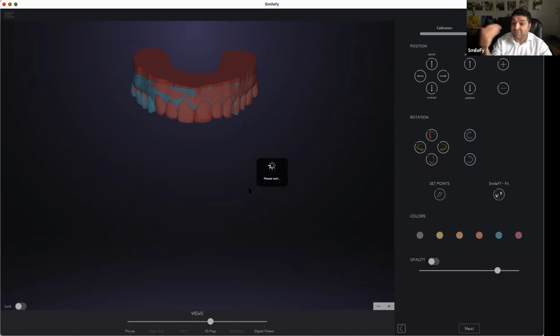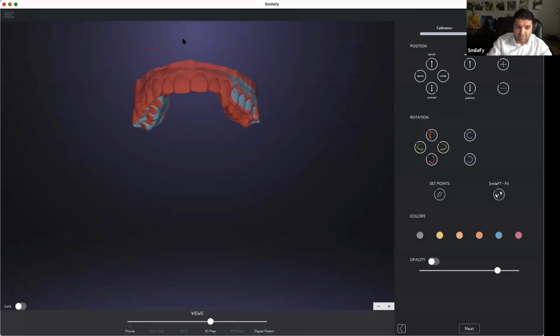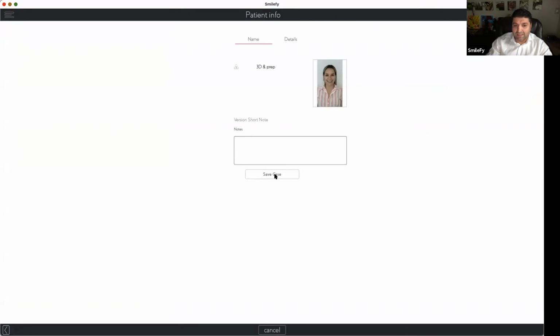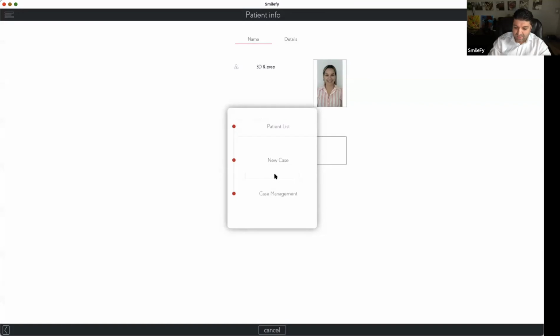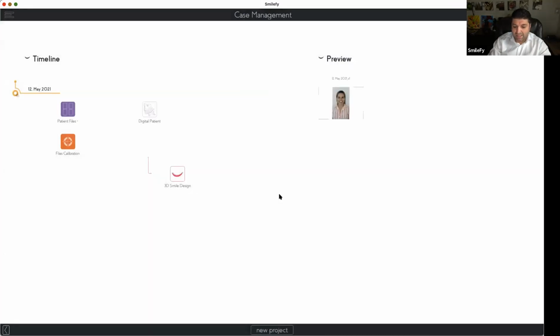We have projects, we have digital patients, and we built on top of the first project a new project. We bring new files into the project. That's the most important thing. You start, you bring new files into the project. Now here we go, it's calibrated, and we're gonna see and we're gonna get more information, more data about the situation of the patient, the condition of the patient, how to design, how to proceed with our treatment.